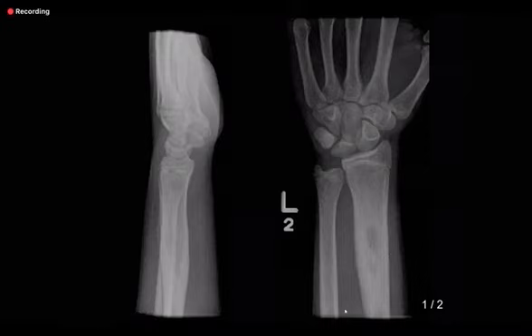Okay. So this is a frontal and lateral projection of a pediatric patient's left forearm, the distal radius and ulna and part of the wrist. On the AP projection, there is a lucency noted in the distal diaphysis of the radius. It has a heterogeneous permeative appearance. I can't put a distinct rim around it, so I think it's got a broad zone of transition.